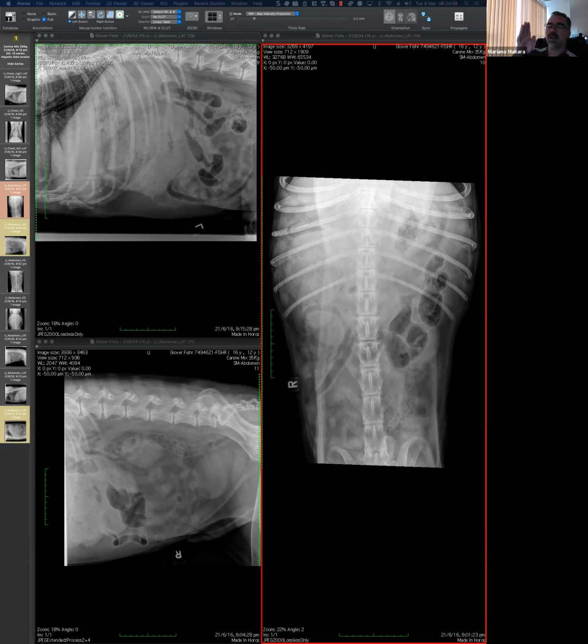No, that's perfect. And I somehow mentioned that, but without using the word gastric axis, which I think is the way to do it. When there is a mass in the cranial abdomen, we immediately need to look at the stomach and decide, is it caudally displaced, is it in the normal position, is it cranially displaced? Usually, when it's caudally displaced, we simply blame the liver. In this case, it seems to be, if anything, a bit cranially displaced. And your reading of that being the possibility of a small liver or an anatomical individual variation, a deep-chested dog, are perfect considerations and extremely important. Yeah.